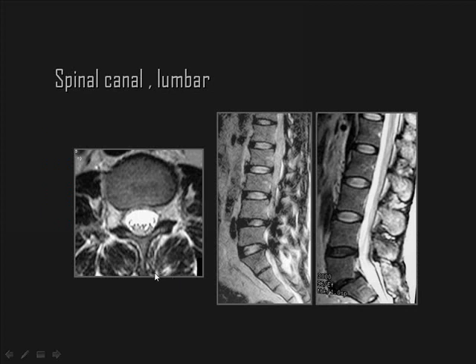Let us start with the spinal canal. How to know that this spinal canal is normal or this spinal canal is stenotic? You can see two patients here. Can you discriminate between the normal canal and the stenotic canal? Yes, this one is stenotic and this one is normal.